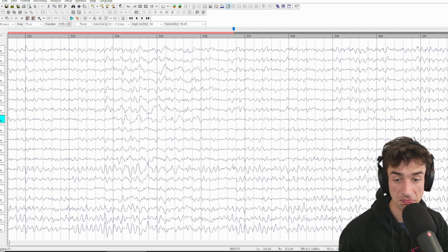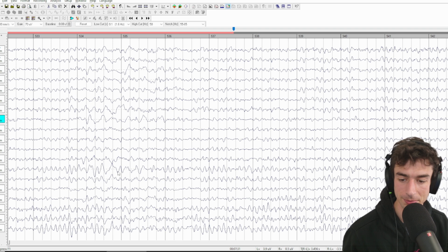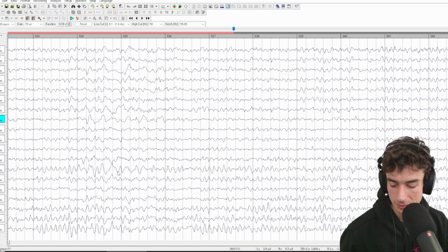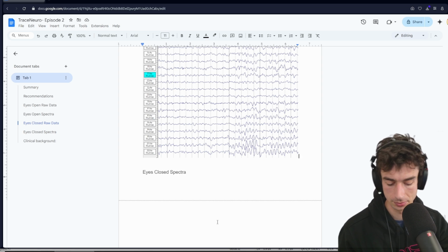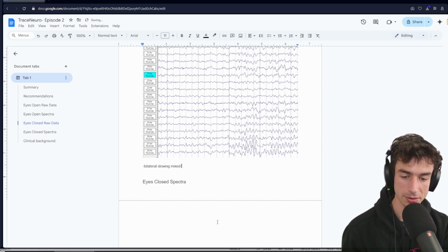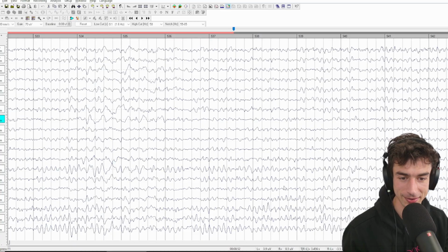Mixed in with beta. And even parietal too. So why not? Let's grab this. Bilateral slowing mixed with beta. Let's call it that.